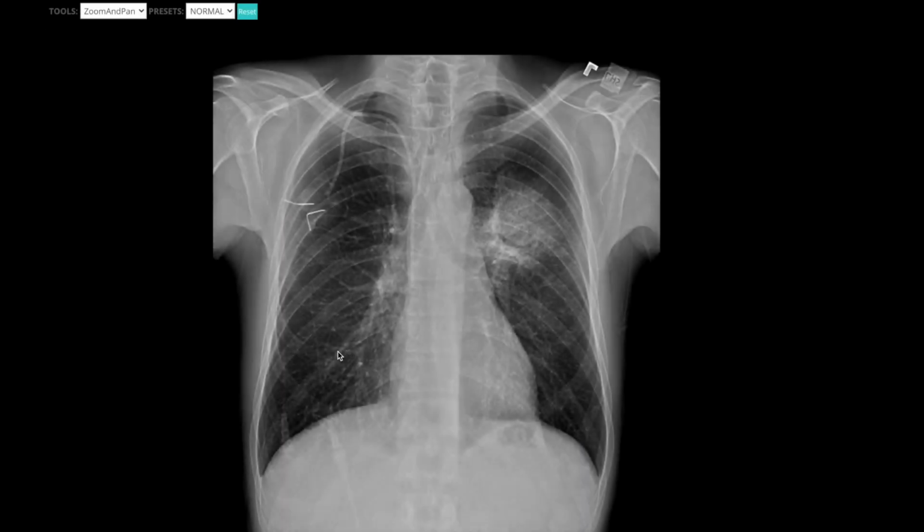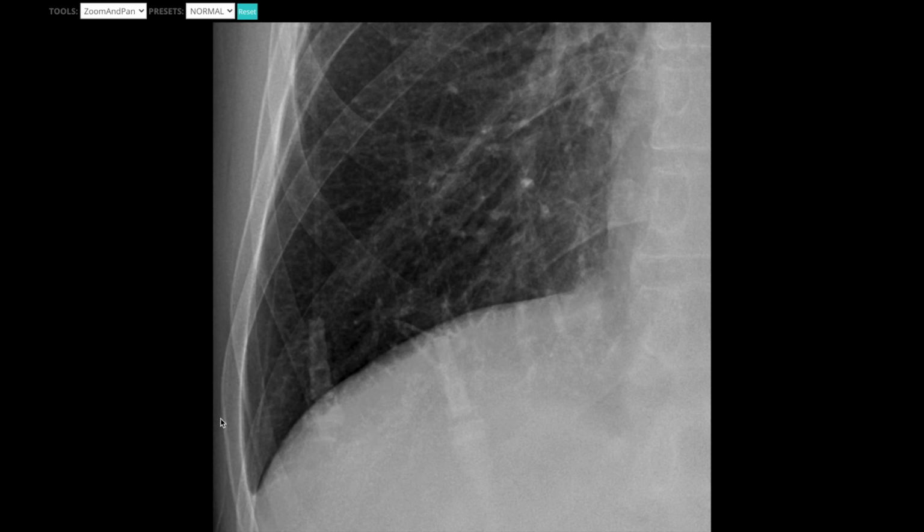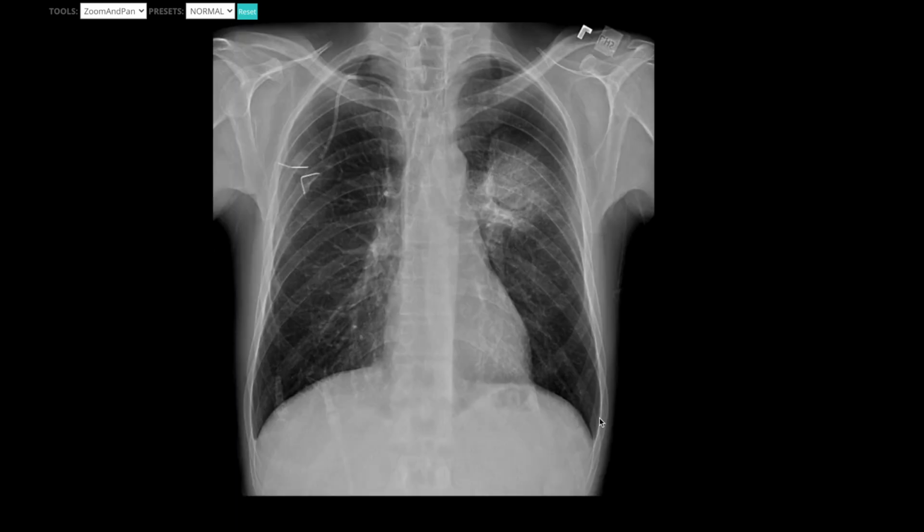So going back to our original case, once I've looked at a pneumothorax, what I'm going to look at next is a pleural effusion. And really what you're looking for is blunting of these costophrenic angles. The one thing that is going to be difficult for you, that is true on an upright image, is also going to be true when you look on a lateral. So you always want to look at it in two different planes. But in a lot of situations, you're not given those. What you're given is a portable supine view, so you may see some blunting in the costophrenic angles.